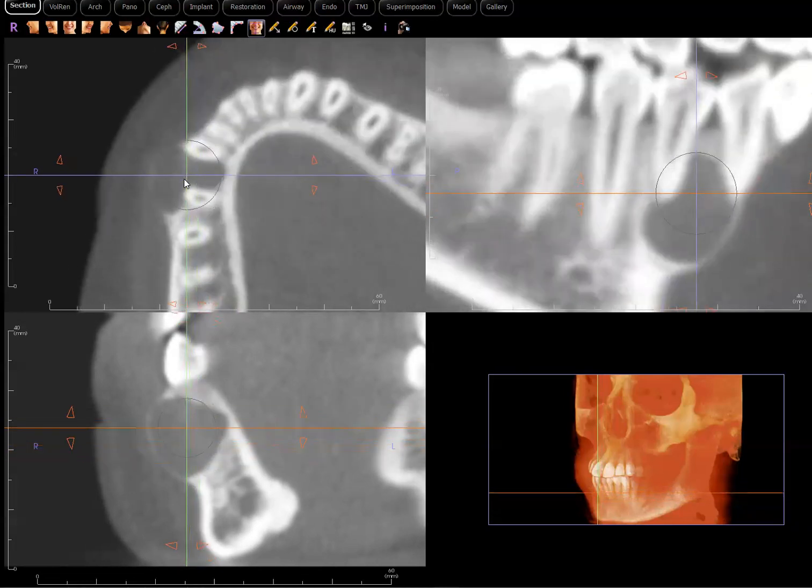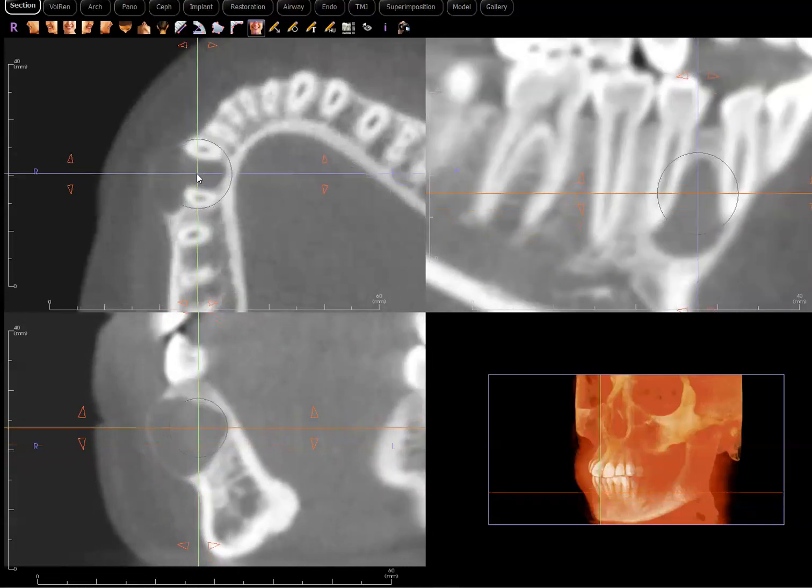But I've been told that histologically, AOT is very, very definitive. It's very characteristic that you see almost like duct-like cells. And I won't go too much into that because I'm certainly not an expert in that area. But it's very characteristic. However, radiographically, at least in this case, I don't see anything that's very characteristic of AOT. It's not pericoronal, but rather it's periradicular. I don't see any internal calcifications. There's no impaction whatsoever. And so, yeah, this would be a very, very tough case.